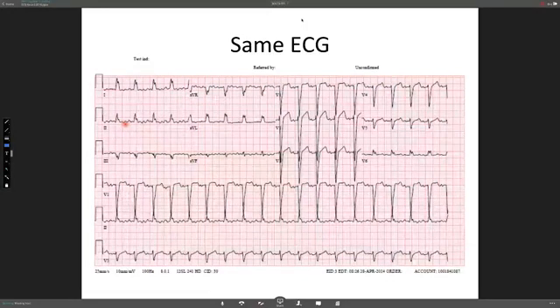You see it in patients with Parkinson's disease, or if there is any interaction with the recording machine. So just be careful and examine all leads. And if you are in doubt, repeat the ECG again with a different rhythm strip. So this is just a quick case.